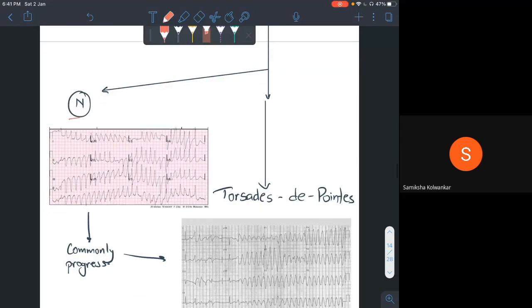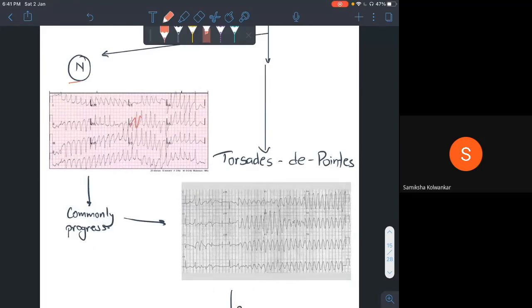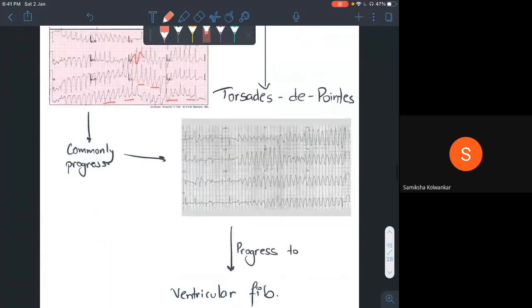There's normal polymorphic, which are just randomly shaped. Their amplitudes are changing again and again. So for example, if you look here, the amplitude is changing, the amplitude is changing here, the shape is changing here. So you just don't really know where this current is coming from.